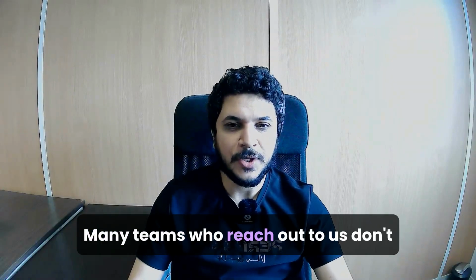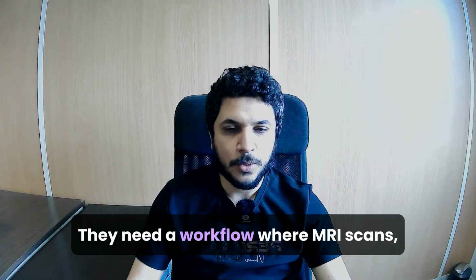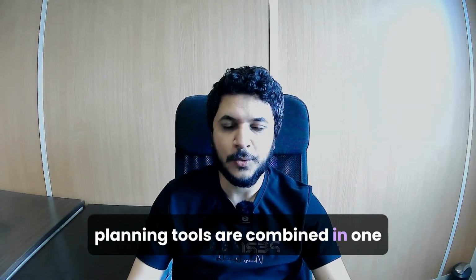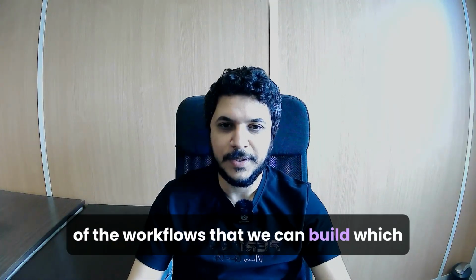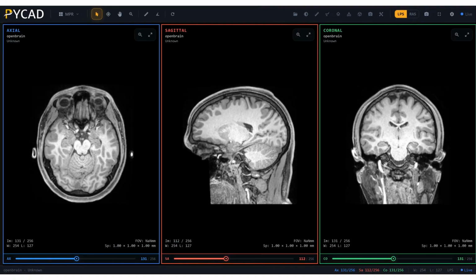Many teams who reach out to us don't just need a generic DICOM viewer. They need a workflow where MRI scans, AI segmentation, 3D visualization, and planning tools are combined in one custom interface. In today's video, I will be showing you one of the workflows that we can build, which is in the neuro space. I have here an MRI scan of the brain, and it's already open in the viewer.